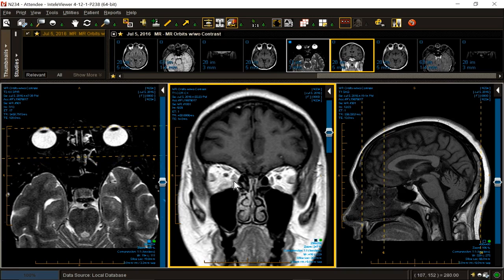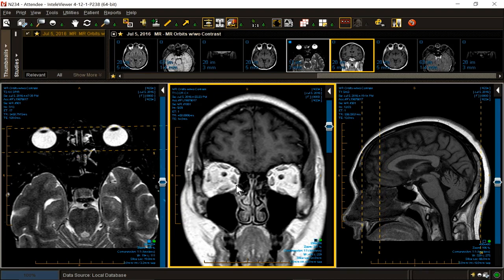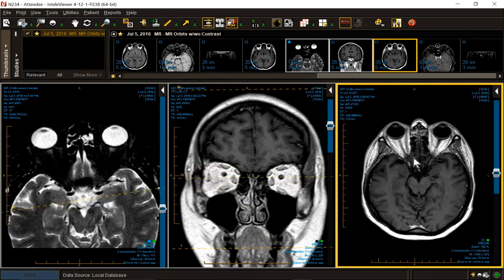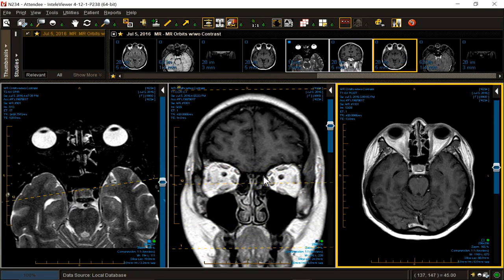For Graves' disease, they're not all the typical muscles, which would be, I'm slow, I am slow. And that would include the inferior and medial rectus, followed by the superior and lateral muscles. So that's a little mnemonic for you registrars. You're not slow, I'm slow. So not classic muscle distribution.